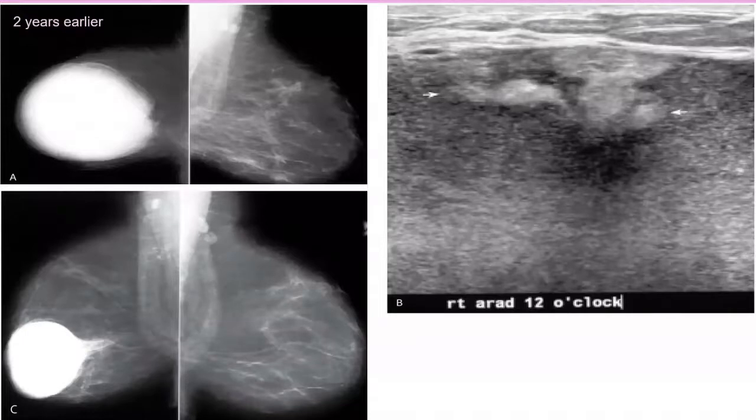It might obscure something underlying, or itself it might be hyperechoic soft tissue. You have no Dopplers, so it will be an apparently complex lesion with two different components, hyperechogenic and cystic, and the lesion was big.